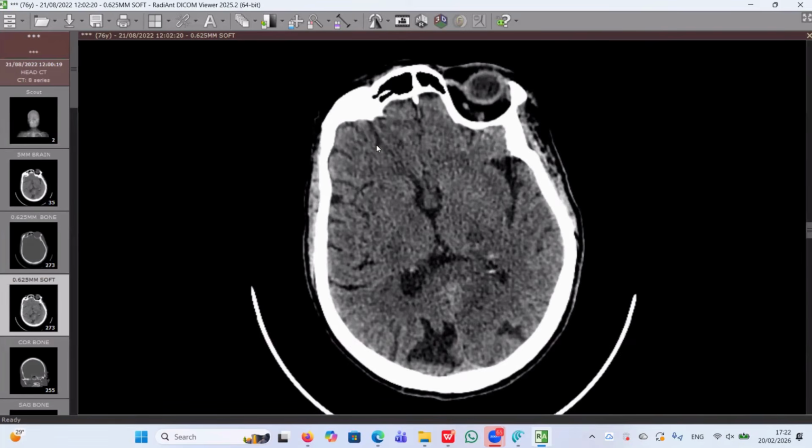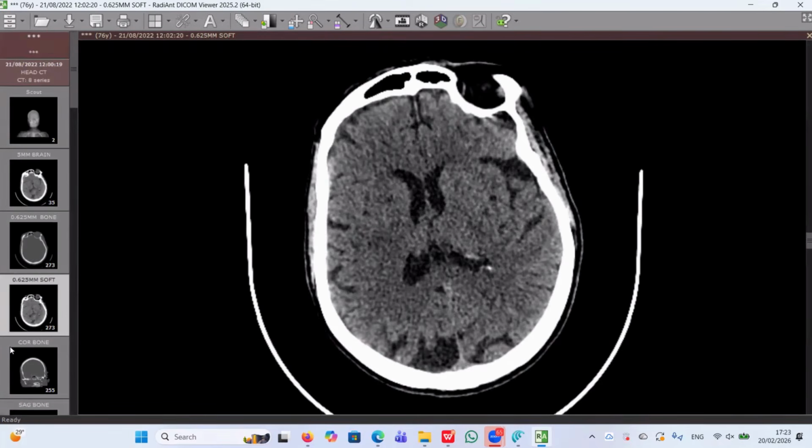Why? Do you have any explanation? Because the left thalamic region is supplied by the PCA territory. Yes, it is supplied by the thalamo-perforating arteries, which supply the left thalamus in this case. So this one is considered part of the PCA territory. Can we move to the next case? Please keep with me.